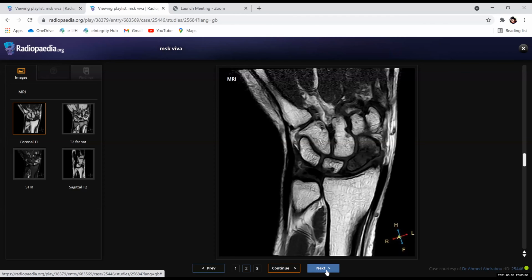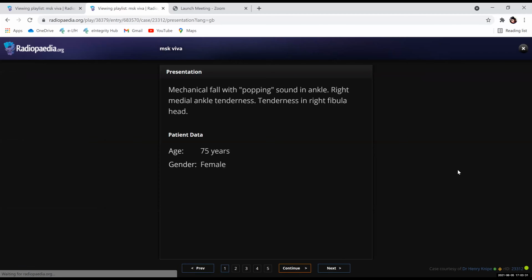But I am also looking for any signs of instability in the other sequences, like sagittal T2, for any VISI or DISI. The lunate looks oriented towards the dorsal. It looks like a DISI.